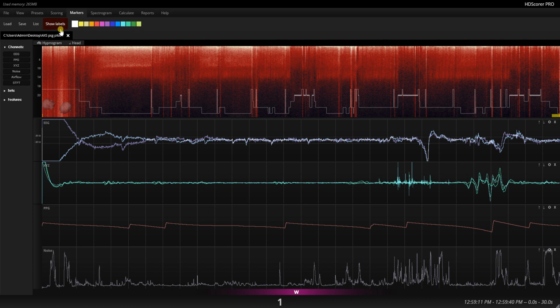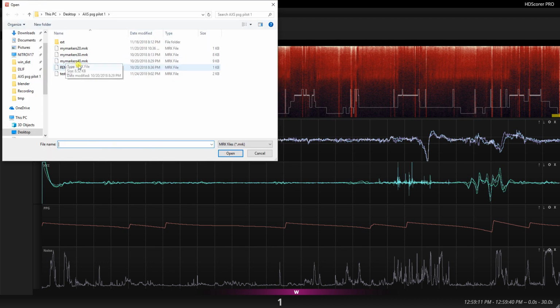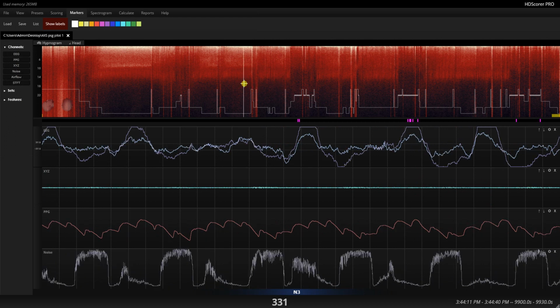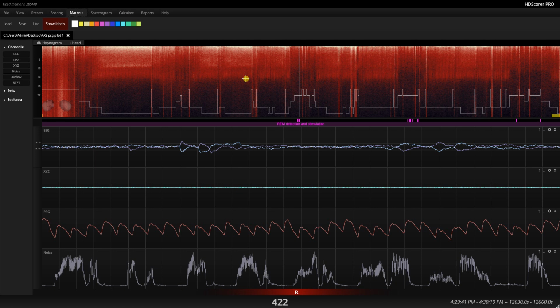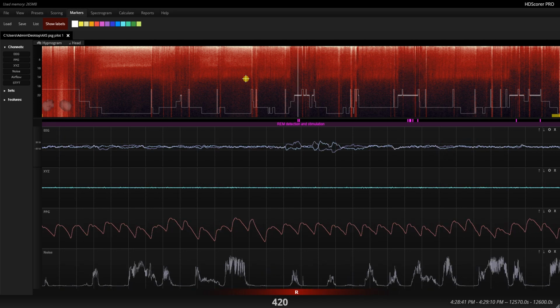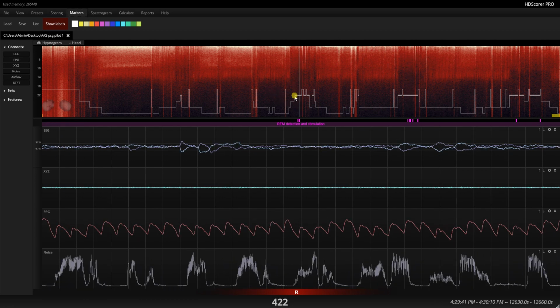So markers, until now you've been able to import markers, for example the REM stimulation markers. There's no help section for the keyboard shortcuts yet, but I'm just going to tell you, if you push the M key you will navigate to the next marker. So that's a very quick way to navigate across markers in your recording. Once you get to the end, it starts back at the beginning. So these markers that you had displayed over here before now are marking the time to which they refer.